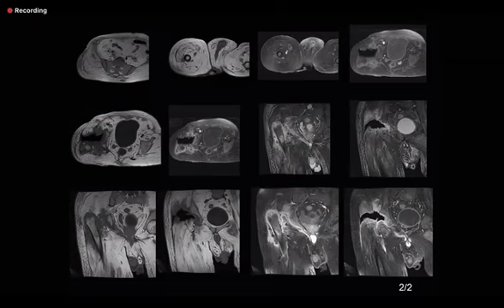And I think overall, this patient has got areas of osteomyelitis within the femur and surrounding soft tissue enhancement in keeping with a collection or an abscess formation there. This patient would need urgent orthopedic review and debridement as well.